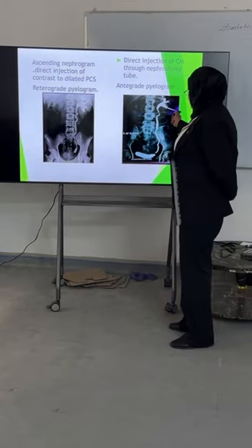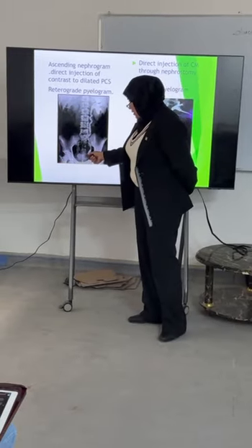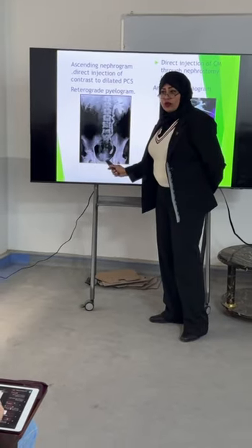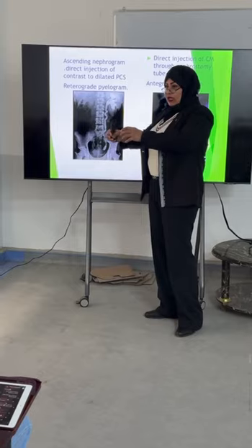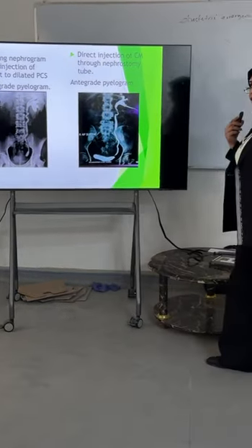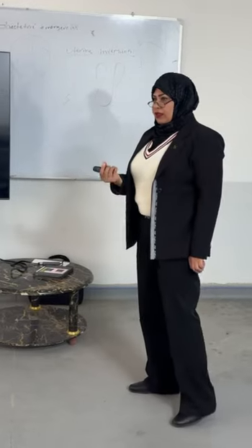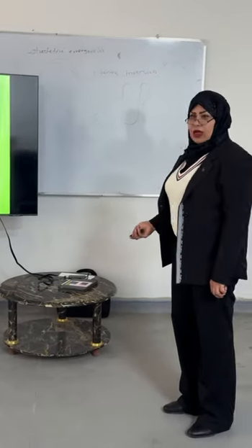The antegrade shows us a nephrostomy tube. In the retrograde, there is no tube because it has passed and the system is filled with contrast. While the voiding cystourethrogram shows a catheter. And thank you for all.